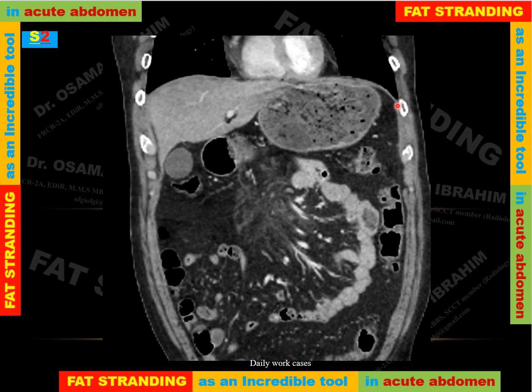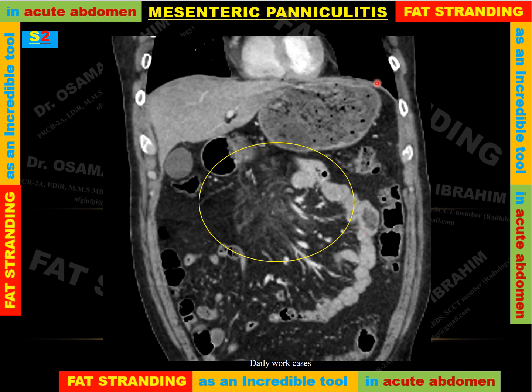Another scenario. This CT abdomen with intravenous contrast shows an area of fat stranding, which appears ill-defined with high attenuation, in the center of the abdomen. However, the mesenteric vessels appear through the fat stranding region with no thrombosis within them. So with fat stranding localized in the center of the abdomen, mesenteric panniculitis or TB peritonitis can both be in the differential diagnosis, and this was a case of mesenteric panniculitis.